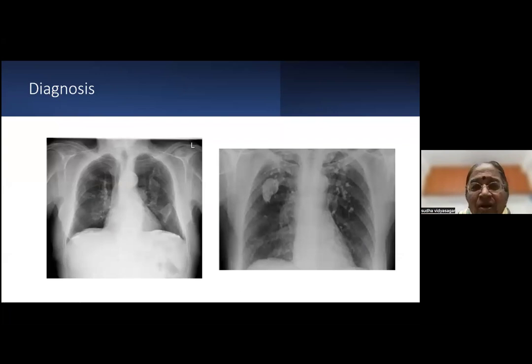Yes, doctor. That's a pleural plaque, isn't it? It's a calcium density, a bone density, multiple small calcifications. These you could call parenchymal, but this is not parenchymal. These kinds of vague shapes and all kinds of shapes that are coming out, they are pleural plaques. They are pleural calcification. Here also you can see pleural calcification.